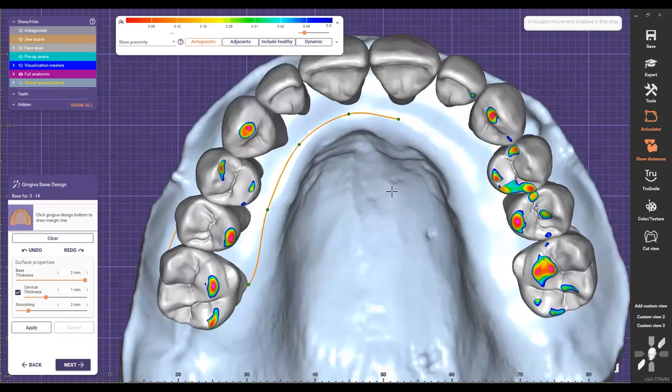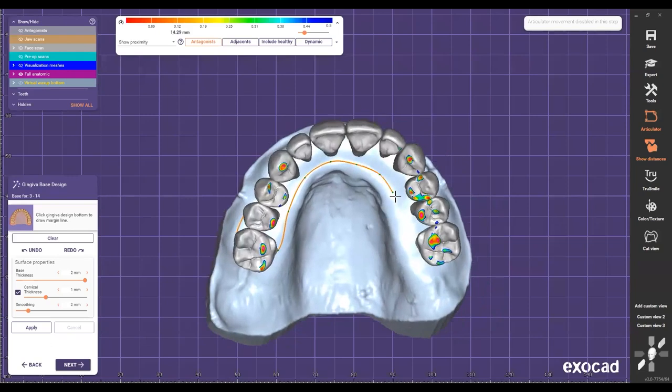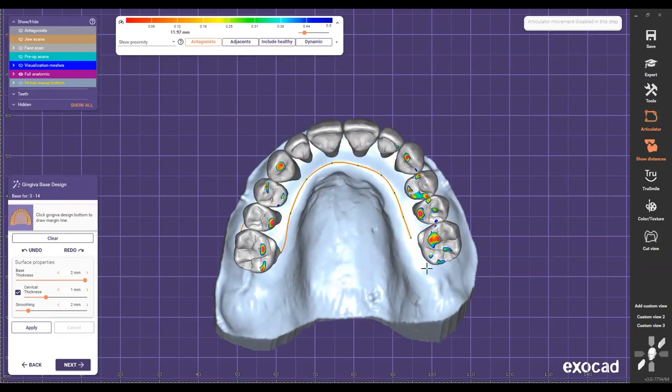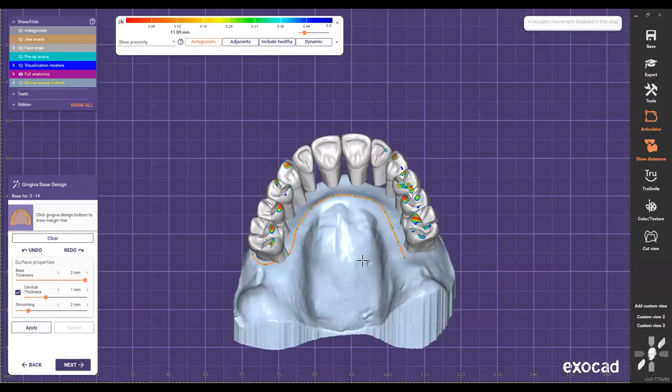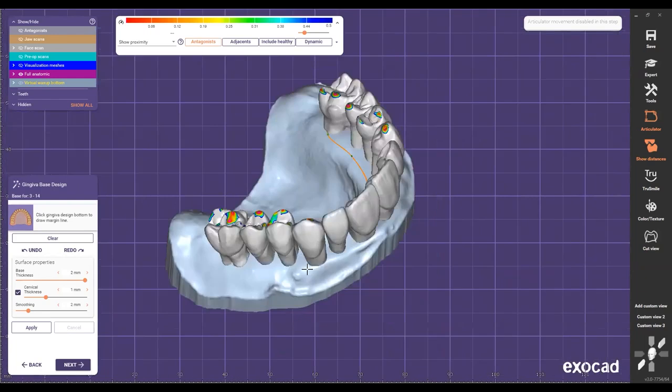Okay, and then I put it ideal, making sure that it's not going to look faint in certain areas, so it's even across the arch. Then I go here, and the same thing here. I want to put the tissue right here on top of it.